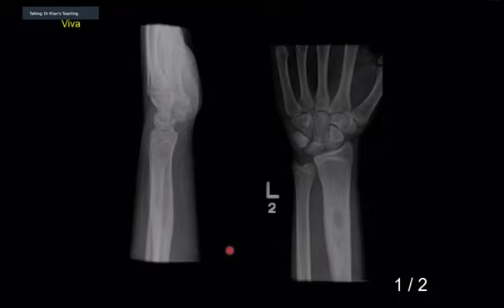Okay, candidate one, once again, please. An AP radiograph of a patient with a skeletally immature skeleton. In the distal radial diaphysis, there is a lucent central lesion with a narrow zone of transition. There is surrounding increased sclerosis. I can't see a periosteal reaction. It doesn't appear to involve the cortex of the bone.